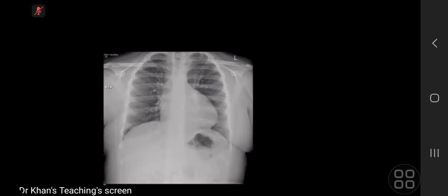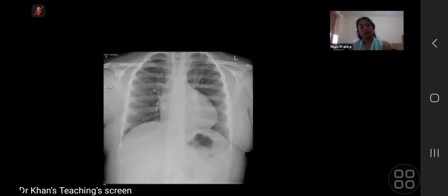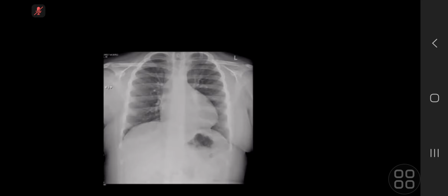Can I ask, is this a cyanotic or acyanotic child? I think it's an older patient, so probably acyanotic. Cyanotic. So a cyanotic heart with increased pulmonary vascularity, and I think also a right-sided aortic arch. So I'm thinking of truncus arteriosus.